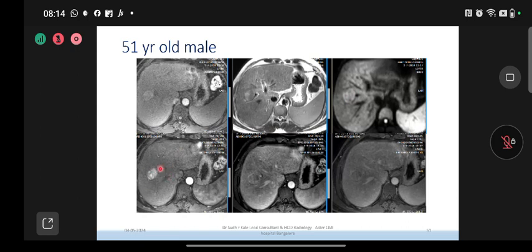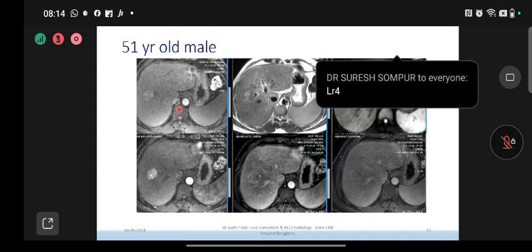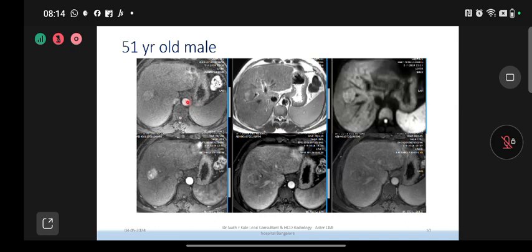Arterial phase hyperenhancement. Sometimes in the current scanners they use some gradient which might really confuse, like you can have this kind of hyperintensity in the aorta, but don't get confused. These are T1 weighted images only. But you can see that this is a contrast image, same contrast, where the intensity really brightens up, the arterial phase hyperenhancement. Then there is a washout of the lesion, and then there is a definite capsule around the lesion.